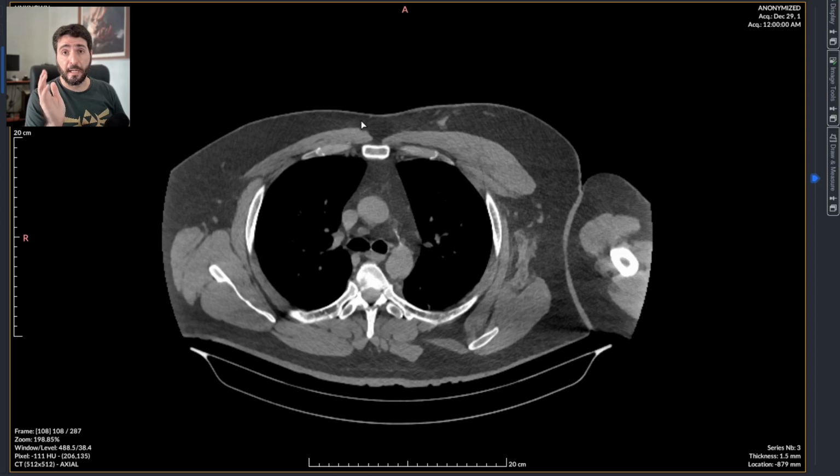Let's see how someone can be stabbed twice in the chest and still survive. So we have to read a CT scan of the chest in 3 window configurations. We have to look for soft tissue lesions, lung parenchyma lesions and bone lesions.